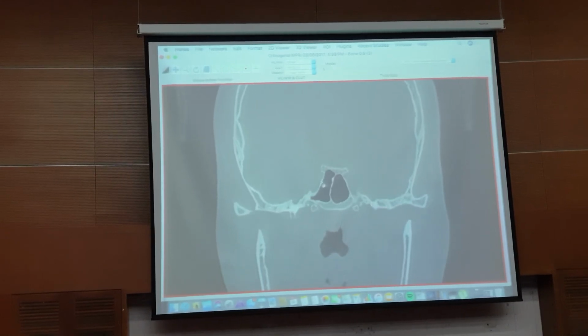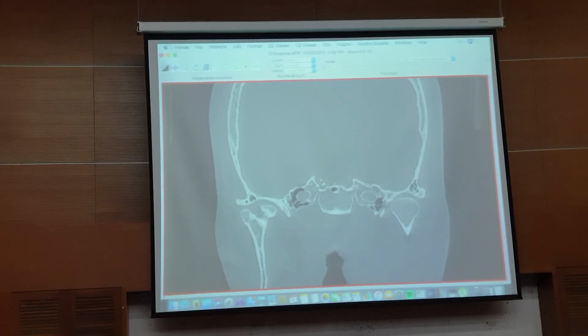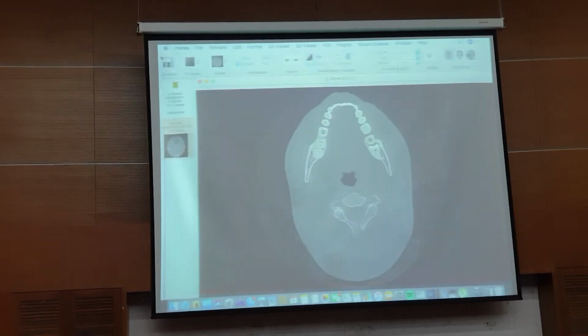I think that's pretty much it. You can see that in this patient there are multiple bombs, as it were, if you were to do some kind of surgery. Excellent! I'm so happy you could see everything. So looks like I did something good.